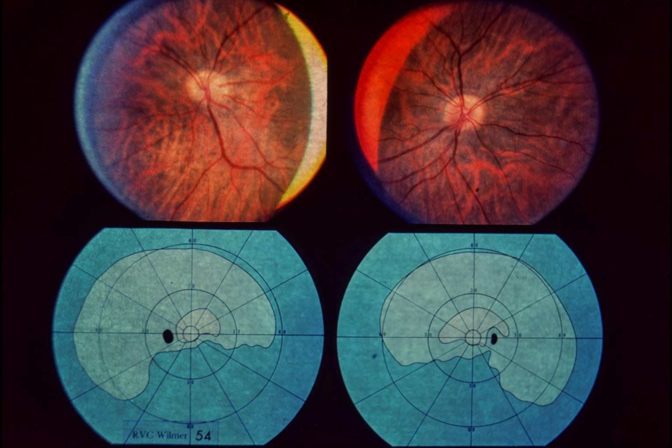Slide 54. Optic nerve hypoplasia with visual field defects and normal visual acuity. This asymptomatic 30-year-old female was found to have bilateral inferior altitudinal field defects on routine eye examination. Visual acuity was 20/15 in each eye, and color vision was normal. Upper left and upper right. The optic discs are small, but the retinal vessels are normal. Both discs are surrounded by an area of hypopigmentation.